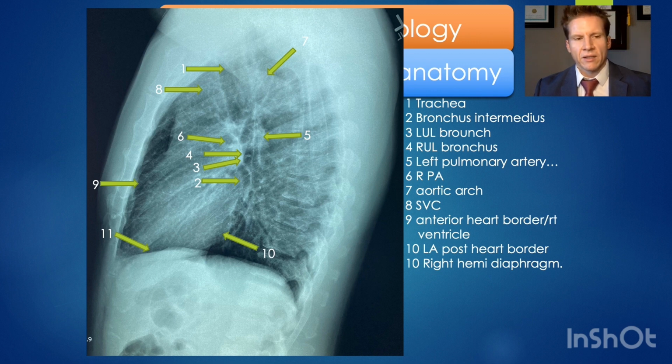When assessing which diaphragm you are looking at, the most reliable method is to see which one continues anteriorly. The left diaphragm gets obscured by the left heart border, and you lose it here as it comes closer to the heart. The right diaphragm is also more commonly elevated compared to the left, but that's not always, and you can verify that on the frontal view.